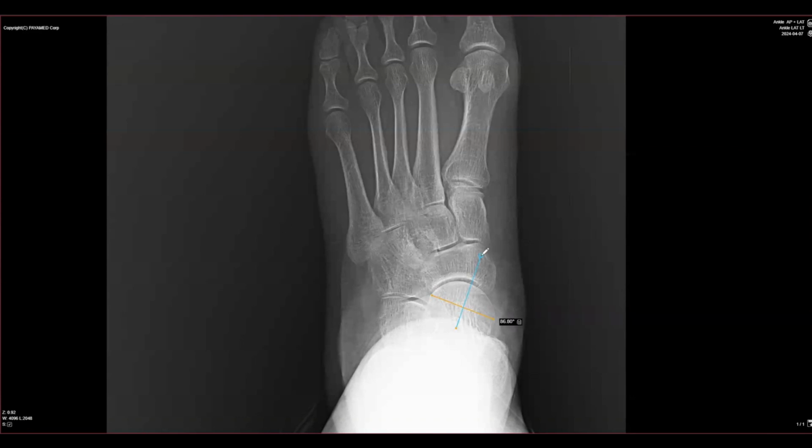We can see we're still on the Cobb angle, but essentially the fact is that the bisection of this interpretation of the articular surface is medial to the hallux, which shows in patients who overpronate or are more likely to have pes planus. So our numbers so far, we're either normal with a slight medial deviation of the talus, medial to the hallux, and a patient would be more likely to have pes planus. So let's take a look at some other features.